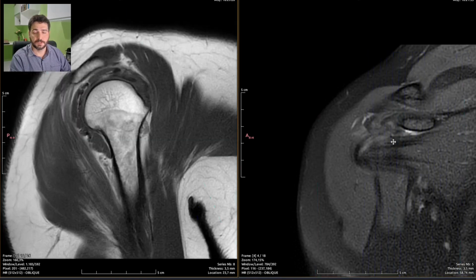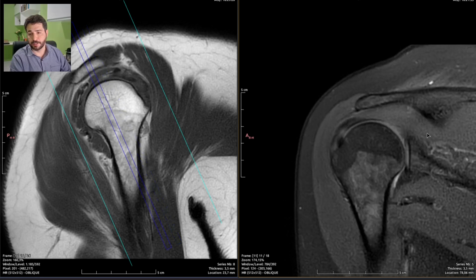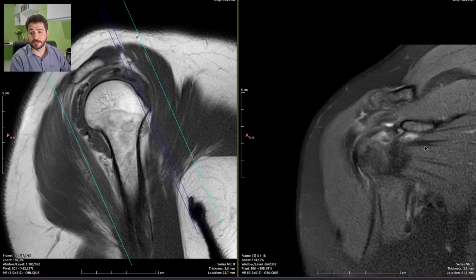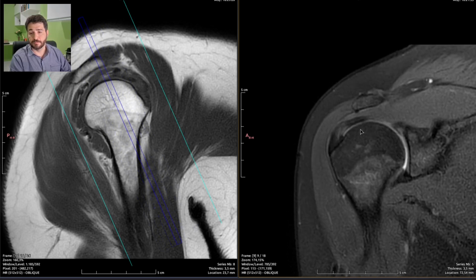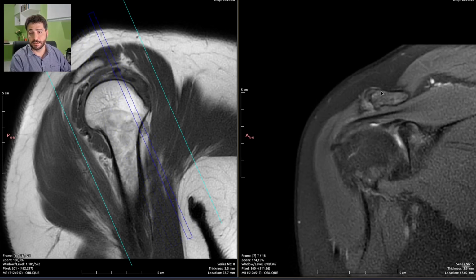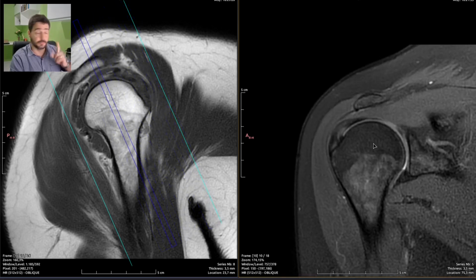So we have degenerative disease of the labrum, the glenoid labrum, on the most upper and anterior portion of it, which is the most common sign of chronic disease of this joint. In this joint, we have moderate tendinitis, mild bursitis, and arthrosis with synovitis. So let's go for the report.